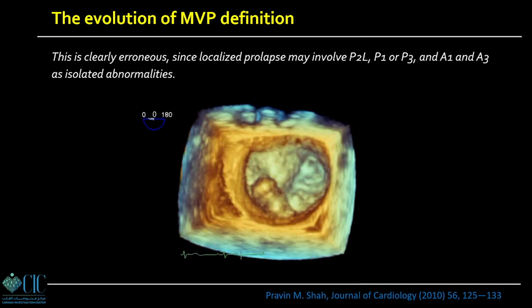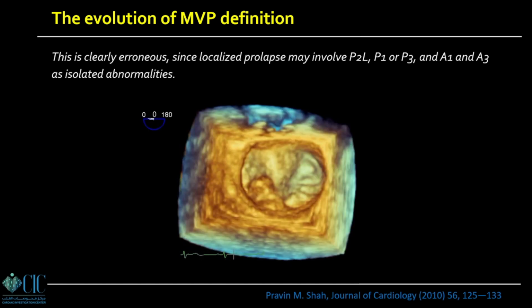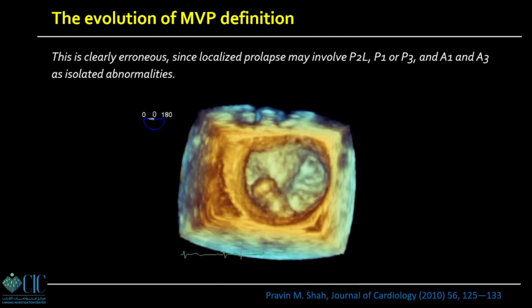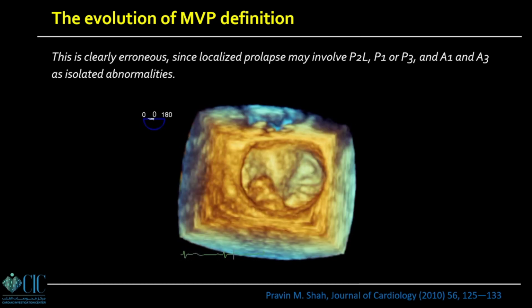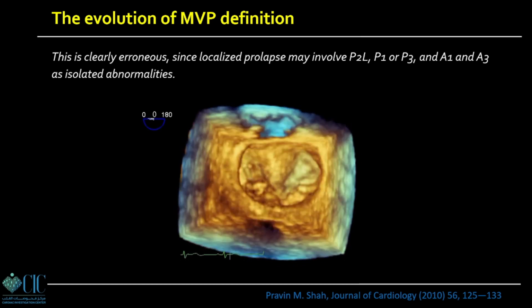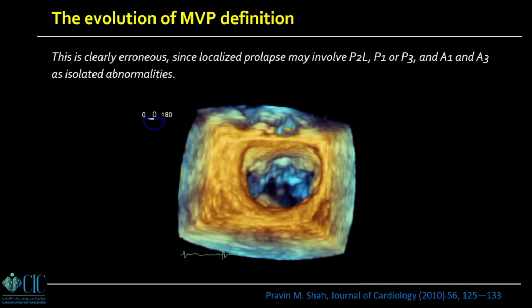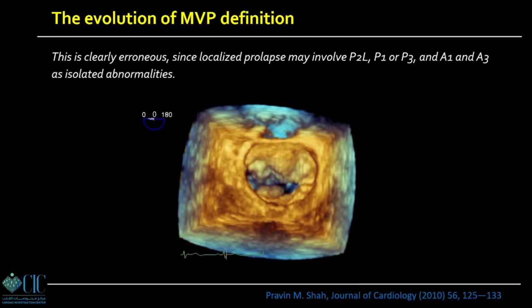Sticking to the anteroposterior view, which is the long axis, will let you miss the prolapse at P1. And you may falsely diagnose that this patient has prolapse in P2, which is not the case. What is the problem of misleading the surgeon? When the surgeon opens the heart, it is empty, stands still, no blood, there is no contraction. So if the tissues are not myxomatous or buckled, the surgeon might not notice the real prolapse. They may think, okay, the echo showed P2 prolapse, I have to work on P2.